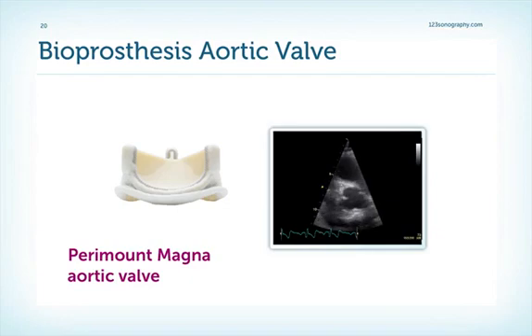But the answer is yes, it is a prosthetic valve. A stentless biological valve. We do not see the struts because there are no struts. What do we learn? Well, we learn that it is very difficult to actually see or detect such stentless valves. The only thing we sometimes can see are 3 little dots here right in the commissural region of the cusps, and sometimes an aortic root which appears to be a bit thicker than normal.